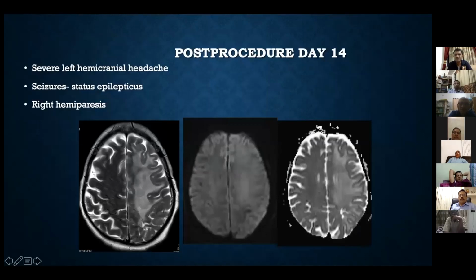So again, whenever you see lack of anterior posterior communicating artery, severe stenosis, and a lot of leptomeningeal collaterals, you can warn your interventionist. And as an interventionist, you can be aware that this patient may land up in hyperperfusion syndrome, and we take precautions accordingly.